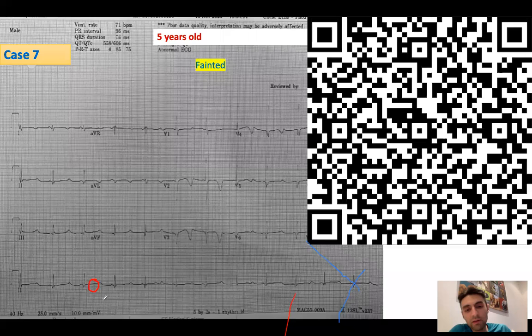And then Dr. Mitwalli, I think you told me about this ECG, if you remember. I don't know whether, yeah. So I think I'm sure you remember.